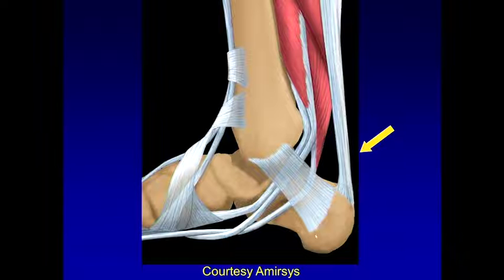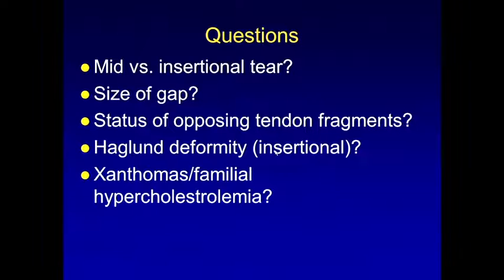Finally, I'm going to talk about Achilles tendon tear. The Achilles tendon is a strong tendon, very commonly injured. We could see it as either a tear or tendinosis. When you see a tendon tear, think about it: is it in the mid-substance or is it an insertional tear?